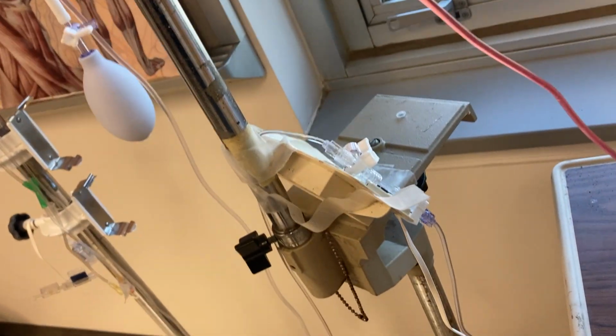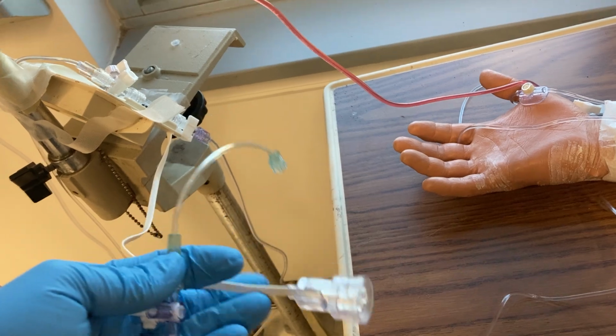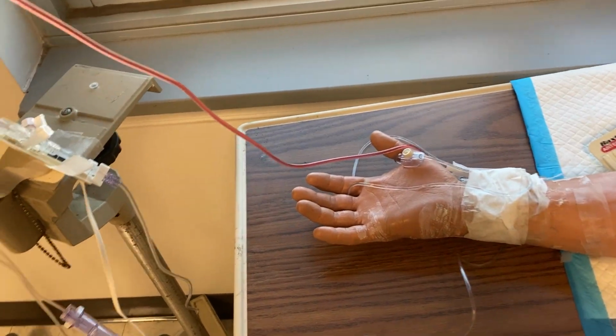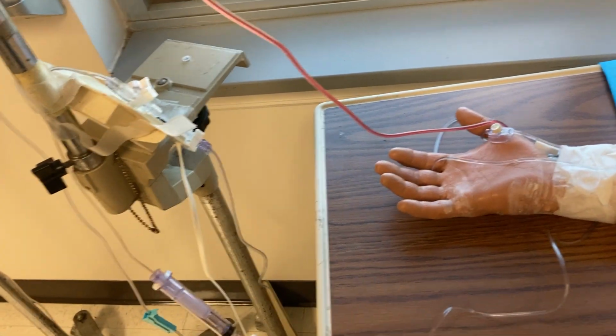You will have a pressure bag. You'll also have a pressure transducer. That transducer has a cable that will be attached to a physiologic monitor, and that's going to take the fluid information from the individual, generated in the pressure waveforms that we'll see on our monitor. You've heard terms like dicrotic notch and so forth.